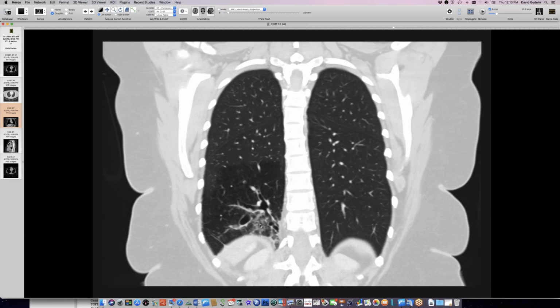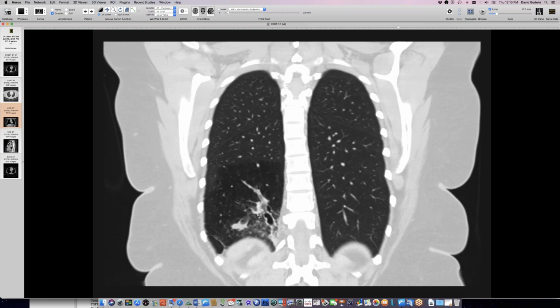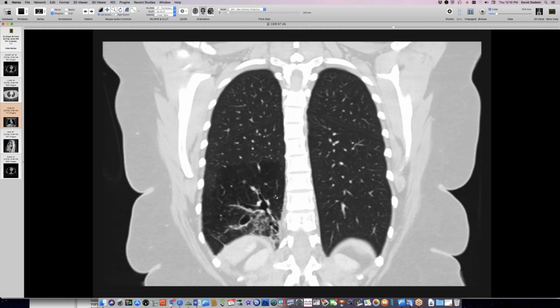I think so. Yeah. Okay, but this is the first time I've ever seen a nice branching pattern like this, a truly bronchial branching pattern. Yeah, those are more developed than often you'll just see. Sometimes I've seen a couple that just have a single bronchus, but that's a really nice example. Okay.